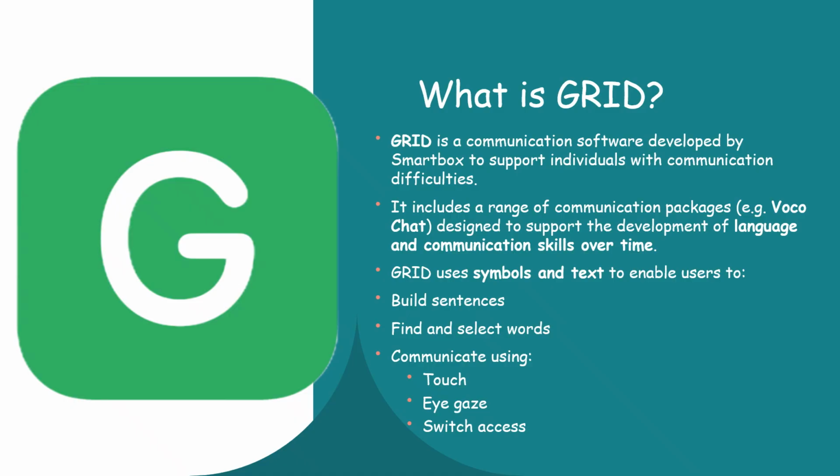So there's lots of different communication apps that we're probably all familiar with. There's things like Proloquo, there's TD Snap, and these are all very good in their own way. But we're focusing on Grid today.